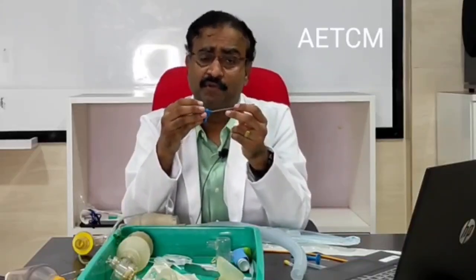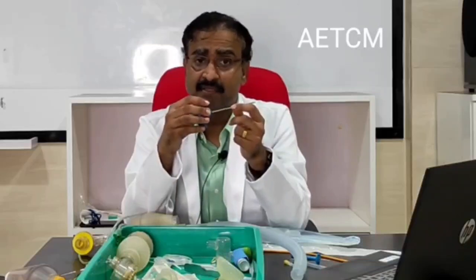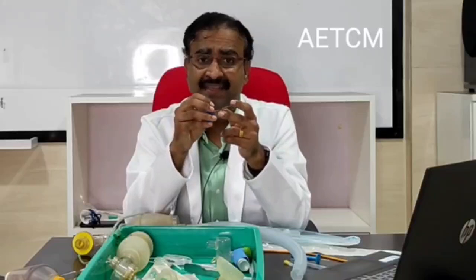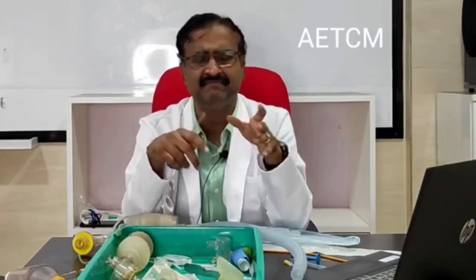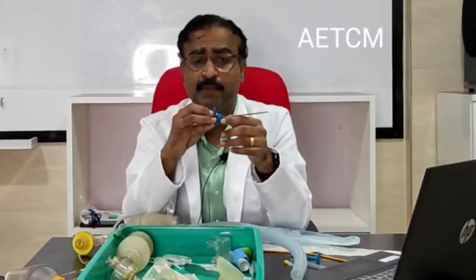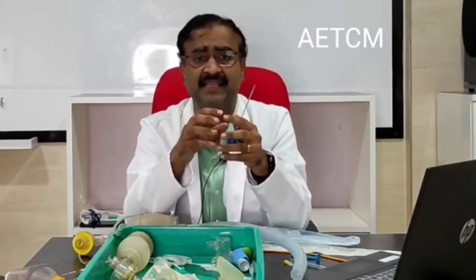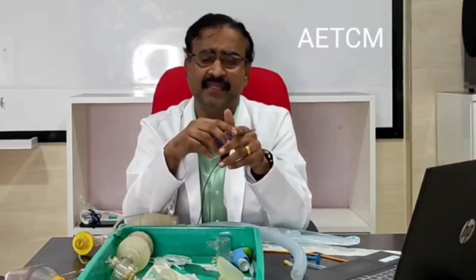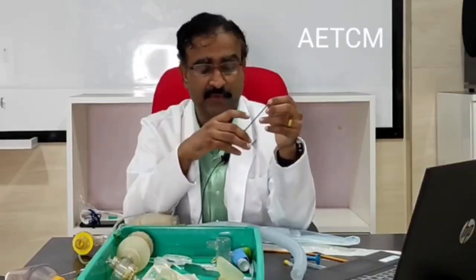In a case of coagulopathy, a severe bleeding disorder, you would also not like to use a bone marrow aspiration technique at that point of time. In a child who is hemodynamically unstable, say severely hypotensive, the child can actually bleed to death. So you don't want that procedure to be done at that point of time. Once the baby or the child has stabilized, and the vitals are relatively fine, only then would you like to do this particular procedure. So that is about the bone marrow needle.